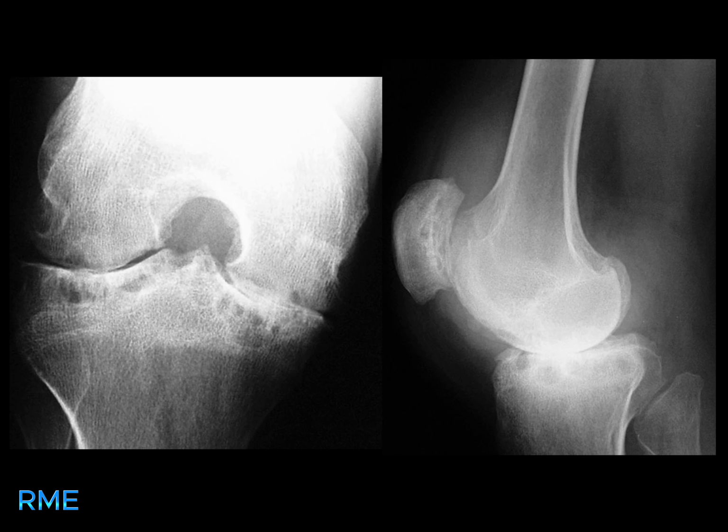Let's move to the next case. What do you see in this image? This image shows severe secondary osteoarthritis with flared metaphyses, widening of the intercondylar tunnel, and dense joint effusion. These findings are indicative of hemophilia with secondary osteoarthritis.